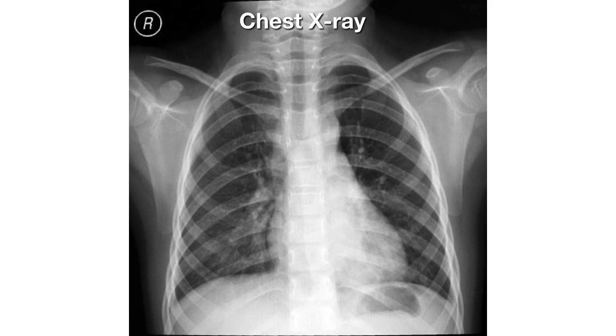The approach I like to use is the ABCDE approach, and I think a lot of people like to use this strategy, rightfully so, because it helps make sure that you don't miss anything. So first you're going to start with A, which stands for airway.